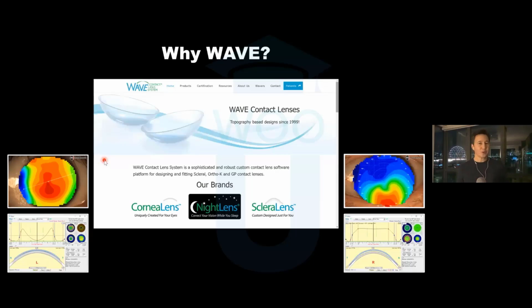So why WAVE? And I'm sure almost everybody here is a WAVE user, but if there's anybody here that's a neophyte to WAVE, why would you want to take this third-party platform? And the reason is hopefully pretty clear in this talk, that what WAVE allows you to do is a level of customization that few other softwares can make possible. So rather than taking an assumed eye from maybe K readings, you're taking all of those thousands of data points, importing it into the WAVE software, and then you're able to build this highly customized lens.